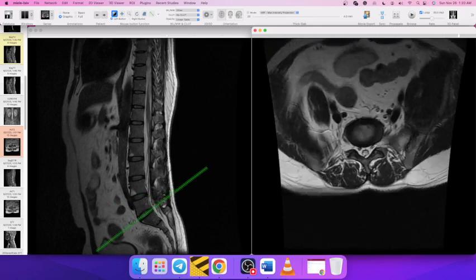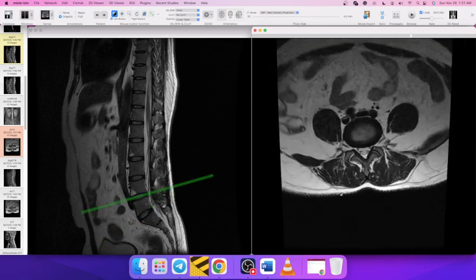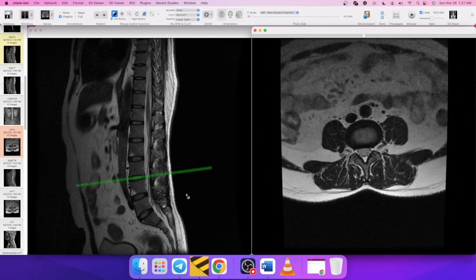And here again there's plenty of space, there's no disc bulge. So except for at L4-5, where there's a mild disc bulge mildly compressing the thecal sac and the neural foramina, and L3-4 just abutting the thecal sac without any actual neural compression, the rest of the discs have no disc bulges.